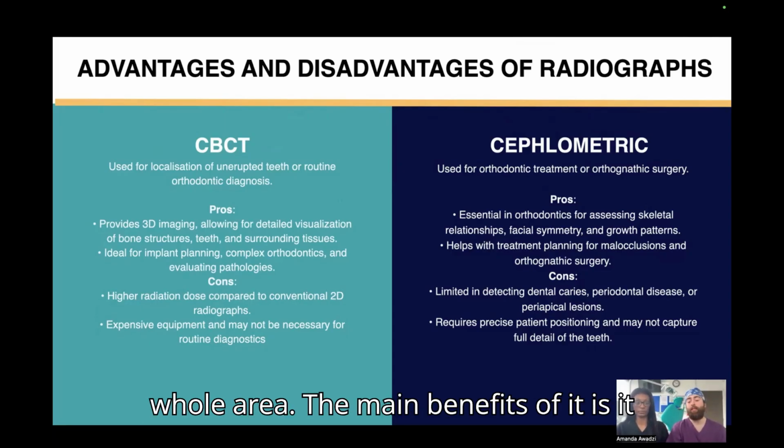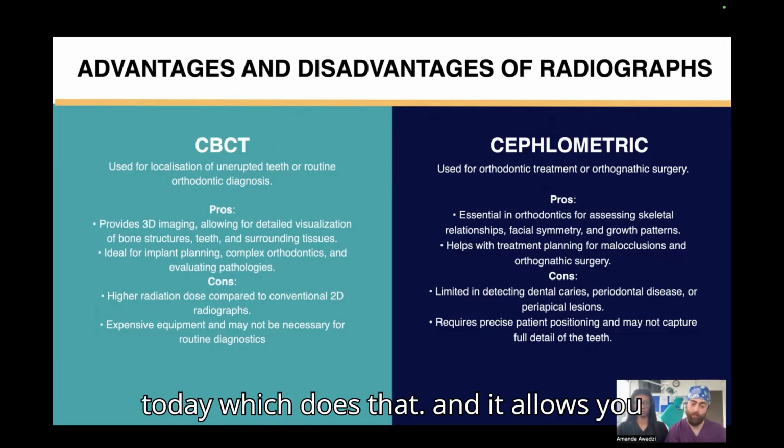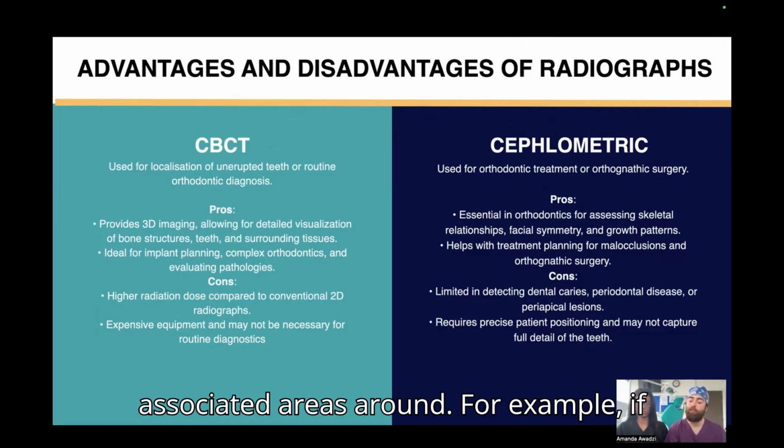The main benefit of it is it gives you a 3D image, which is probably the only X-ray we're going to talk about today which does that. And it allows you basically to see the whole detail of the area you're focused on and the associated areas around.